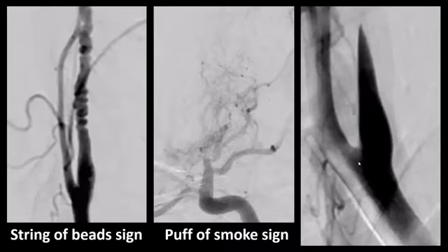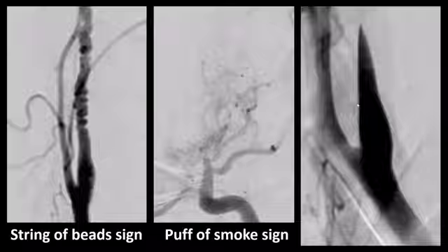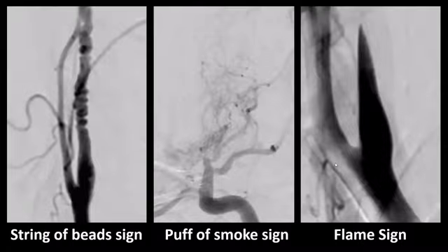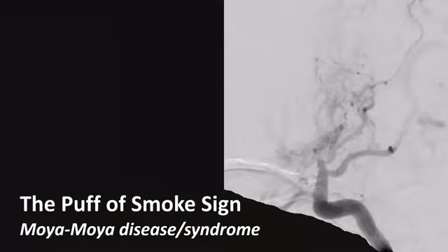And over here, we see an abruptly ending contrast opacification of the internal carotid artery, but it's not abrupt. We see more tapering, and this tapering looks a bit like a flame. This is the flame sign, and it's classically seen in internal carotid artery dissection. This is the puff of smoke sign again.